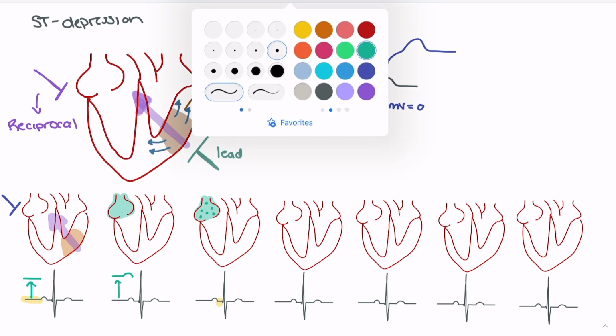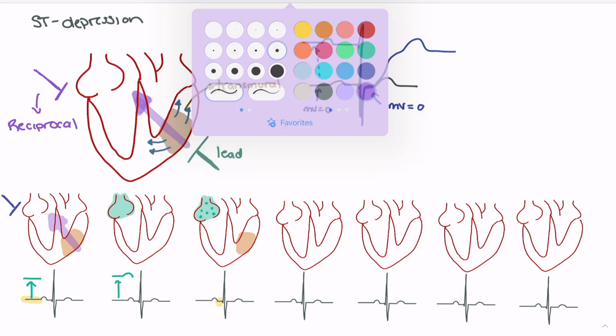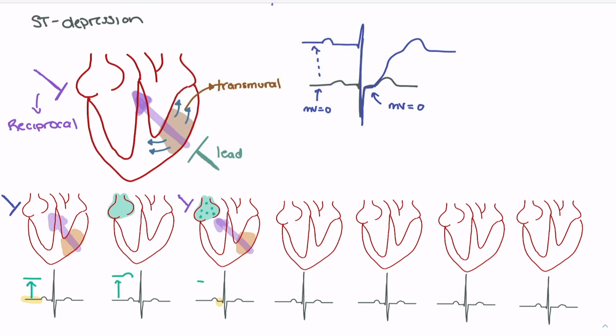And as a result, because the ventricle hasn't done anything yet, we're back into a position where we can see that net flow of electrical activity. We know that's going to move towards our reciprocal lead. So again, there's net flow of electricity towards the reciprocal lead. As we look at the reciprocal lead, that PR segment goes right back up to that baseline that is indicative of the injury potential.